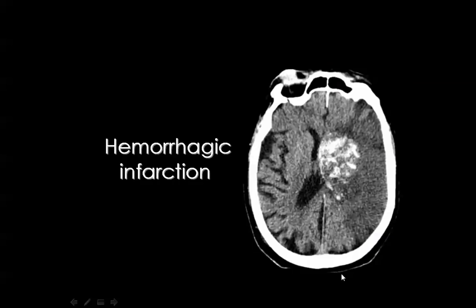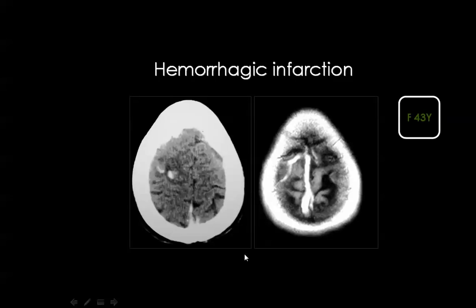Then it's not difficult to diagnose the hemorrhagic infarction itself, and you see an infarction, a large area of hypodensity containing foci or areas of recent blood density. This is hemorrhagic infarction. But what is more important is to look behind this appearance for the most likely cause. Either you look carefully at the venous sinuses for venous sinus thrombosis, or you judge the clinical picture of the patient for cardiac troubles, which may be the source of emboli.